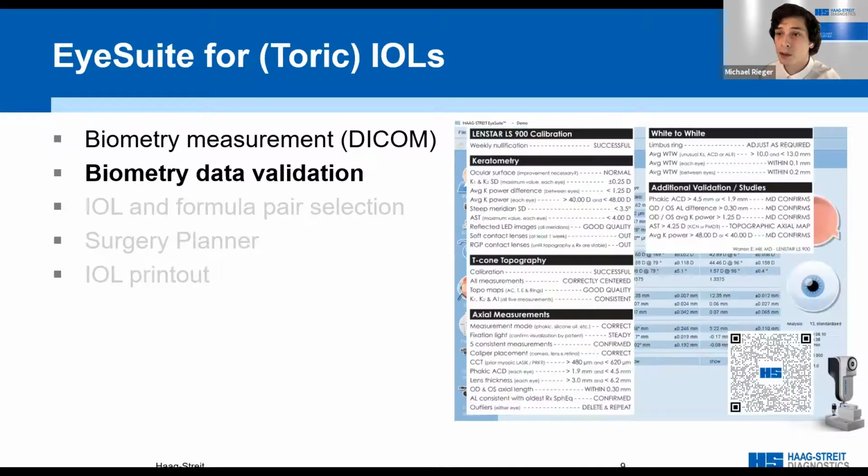As mentioned already, we present warning messages to the user once the taken measurements don't fulfill the best practice guidelines provided by Dr. Warren Hill. These were also discussed in a previous webinar. I just want to bring them up here once more because I have several questions about these guidelines, and I just added here on the bottom right the link to download this PDF file.